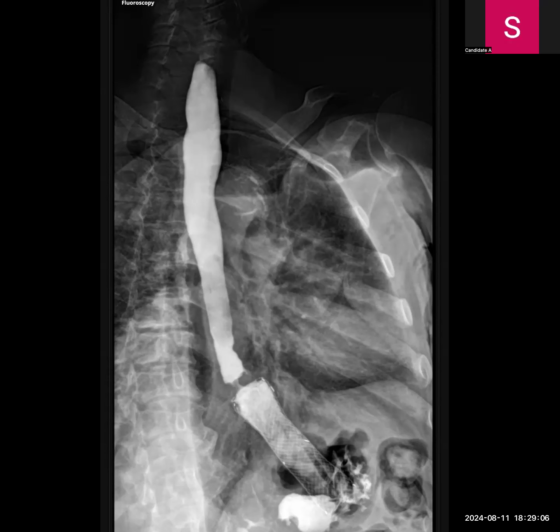So this could be a case of CA esophagus that they have stented because it is a locally advanced disease. Or this could be a post-operative case of anastomosis with stenting being done. I would like to review the history and clinical file of this patient to see what kind of surgery has been done. And you're right, it is a case of esophageal carcinoma. But before you ask about the surgery, can you tell me what else you are looking at in the image? What do you think is happening?